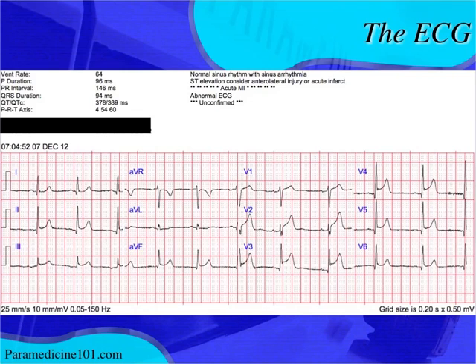I didn't present this initially with all of these findings up here where it says acute MI and everything, because this 12 lead does look like something else alone. If you take away the patient presentation, this 12 lead might indicate something else. The big two things that everybody mentioned on the Facebook site when I presented this case was either pericarditis or acute MI. Pericarditis or acute MI. And I understand why you would think either one of those. So let's look at this EKG and see what the indicators are.